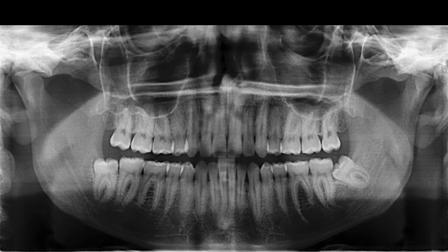So we go through. I check all of that. Make sure there's nothing going on. Make sure there's no cracks or fractures in the jawbone.